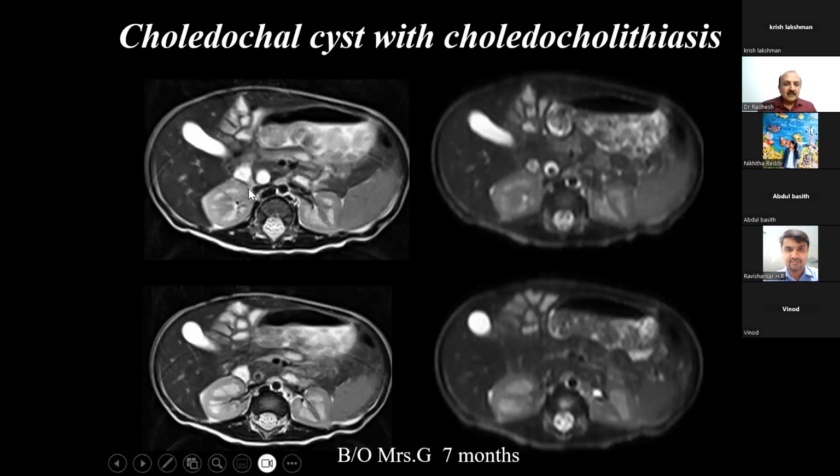Now, again, the choledocholithiasis, look at this, so beautifully seen here. You see the calculus here, you see what is this? This is the vertebral body. Looks like a calculus anterior to the vertebral body. No signal within it. Aorta, isn't it? Flowing blood is always dark. I told you in the last class, even if it is T1, T2, only on a gradient echo sequence do the vessels start looking bright. So this is a T2 sequence.